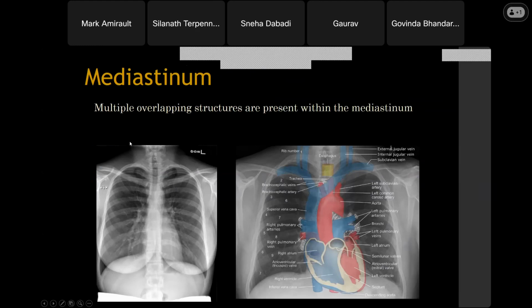All right, so we can talk a little bit about the heart on our frontal view. Another checklist item when interpreting chest radiographs is to look at our heart borders. I'm going to start on the right here. You don't get a great view of the right ventricle on the frontal view, but you have your right atrium here, this border.